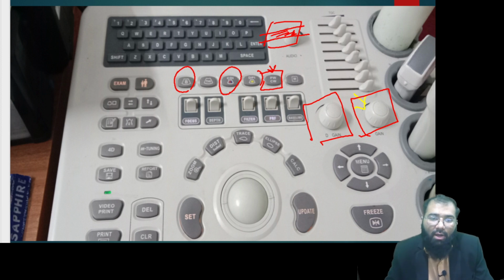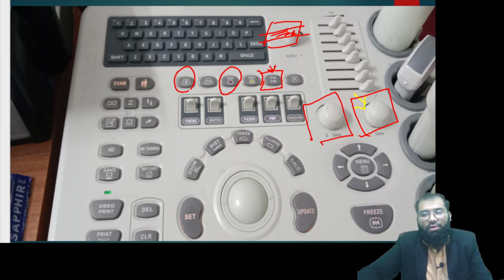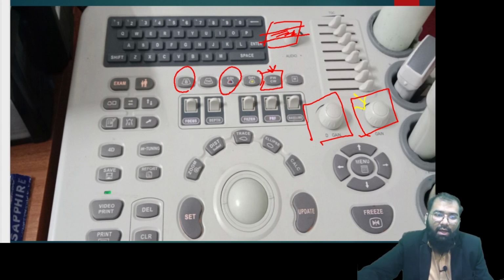Similarly, we have seen about power Doppler and spectral Doppler. So we have seen that how do you apply color within it using color box button, and then how do you put the spectral Doppler within it with angle of insonation, and we have seen basic terminologies, that what is sample gate, how it should cover 2/3 of the vessel wall, and very important we have seen what is D gain, and that also should be kept optimum so that whatever velocities you get are reliable.